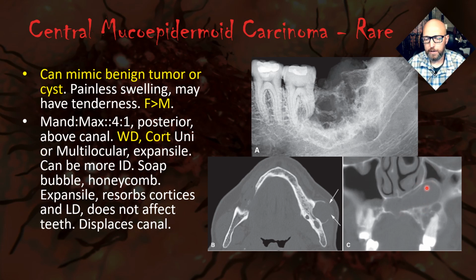Maybe if we look through the entire volume here, we'd see signs of more of those ragged borders, just like I was talking about on the previous slide, where something hints you in the direction that it's more malignant or more aggressive than your typical benign tumor. But just based on this, everything about these looks more like something benign. So keep that in mind.